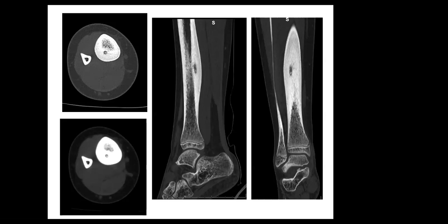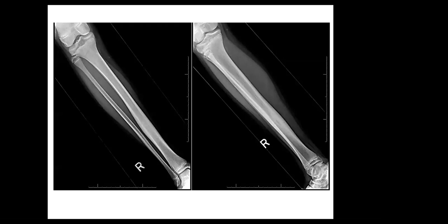Okay. All right, let's go back to the radiographs. I think you did well on the radiographs. You detected the area of cortical thickening, sclerosis, and the nidus. I think we just need to get the terminology right, because you said there's edema. We don't normally see edema on the radiographs, neither on CT.